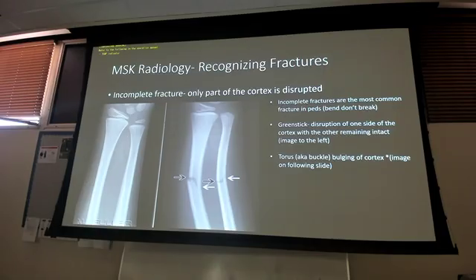Mostly in peds, there's one case where it's not that I'll show you, but mostly in peds. And why is it mostly in peds? Kids are bendy. Their bones haven't hardened yet to where they need to. So kids' bones bend and don't break a lot of times. So when you have this right here, where I have a complete cortex on one side that is bent, and then I follow my cortex here, and I have the gap, and I have a fracture that comes in, and this is on both bones, right? So they bent, broke on one side, didn't go all the way through, I have an incomplete fracture. That's called a green stick fracture.